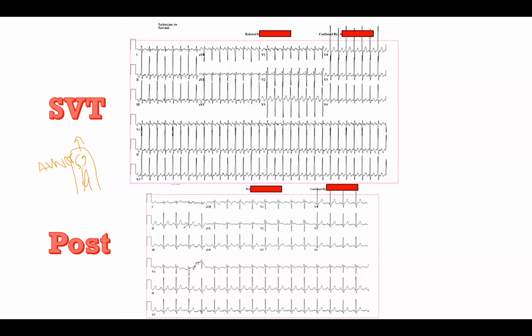But it's hard to say, right? Because, for example, if you look in lead 2, the T wave looks a fair bit different than the T wave in sinus. So the question one might have is, is there a P wave, a retrograde P wave, that might be inscribed on top of this T wave? However, I think you correctly and astutely pointed out, Vlad, that there does appear to be a little bit of an extra complex at the end of the QRS in lead 3 that we don't see in sinus rhythm. And it looks like it's right on top of the QRS.